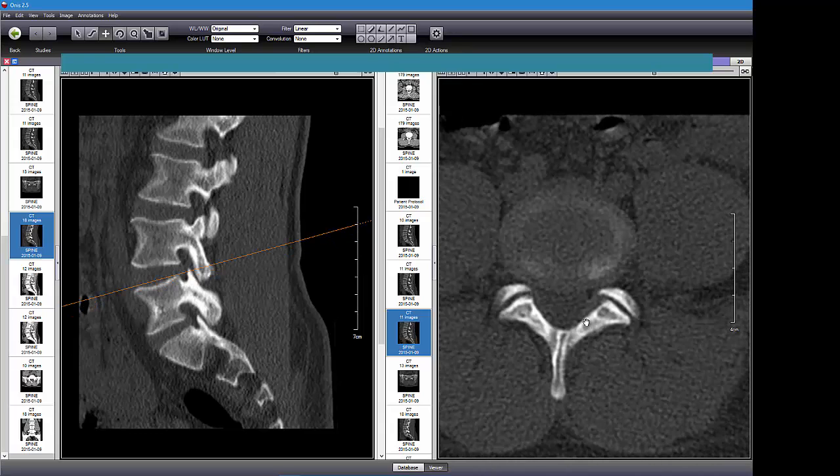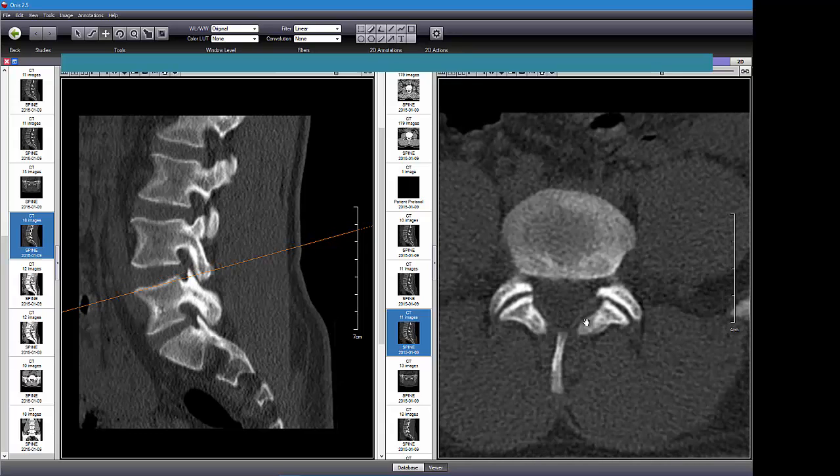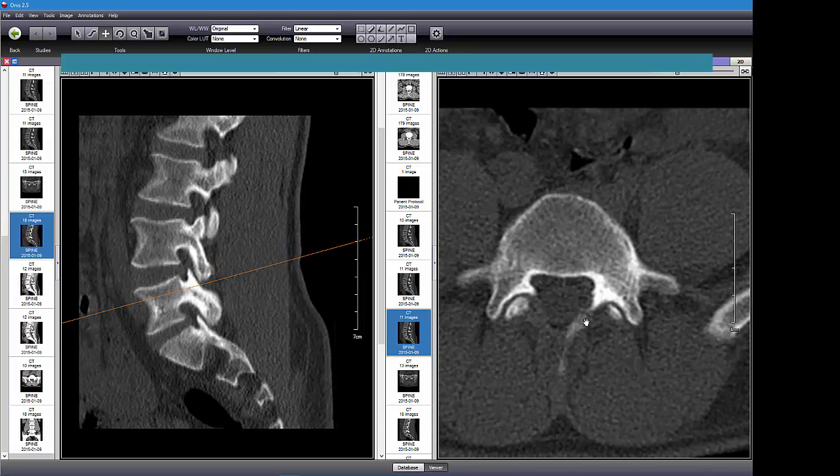Okay. Well, maybe it doesn't go up that high. It doesn't go up that high. How about let's see the pedicles of L5. Okay. Here's the stubby little pedicles, very short. Okay, super short pedicles. I can still make out the thecal sac here. Let's go look at the pars, how about? So we need to go down to here to see the pars.